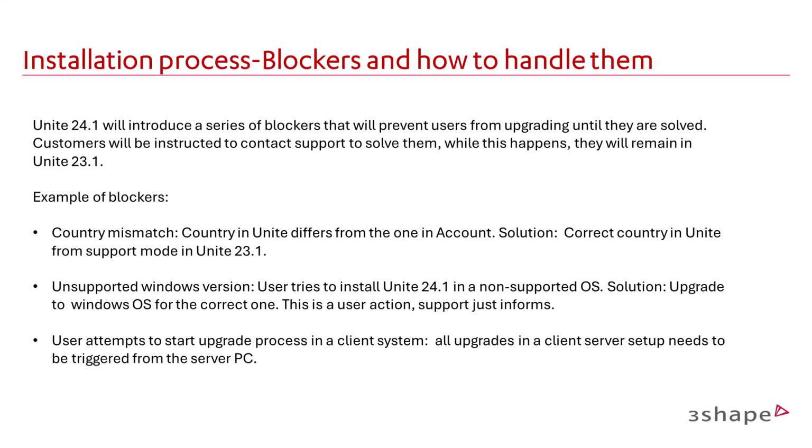The solution is to correct the country in Unite from support mode in Unite 23.1. It's essential to do this carefully, as the country selection affects which updates are available based on regulatory requirements. If there are doubts, please contact 3Shape support.